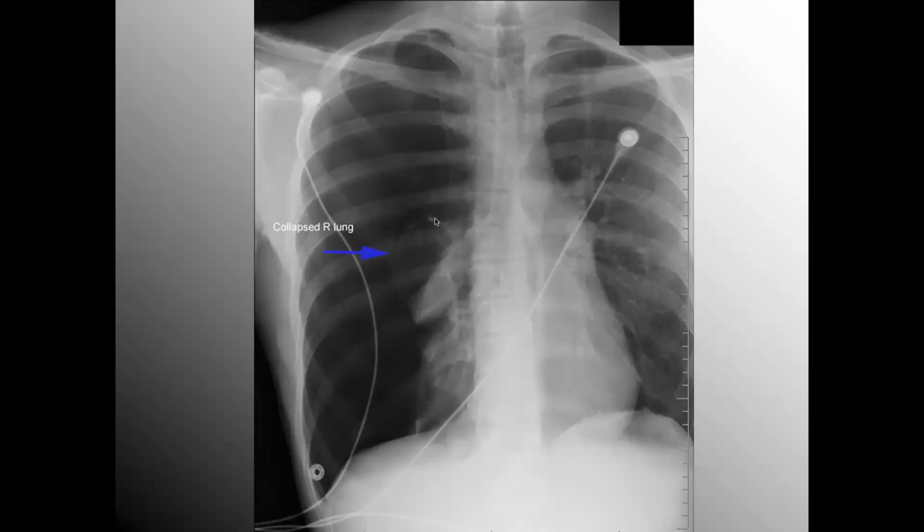Obviously, this is the right lung that's collapsed. You can see the outlining of the visceral pleura to the point where it's separated the right upper lobe from the right middle. That's pretty major. And that's the outlining of the lung tissue. All of this is free air. What you're noticing on this right side, you see no interstitial markings. You see no vascular markings. It's just ribs and lucencies. And compare it to the left side of the lung here.